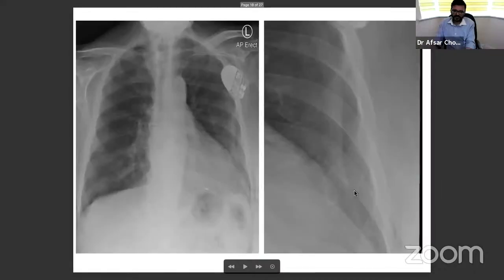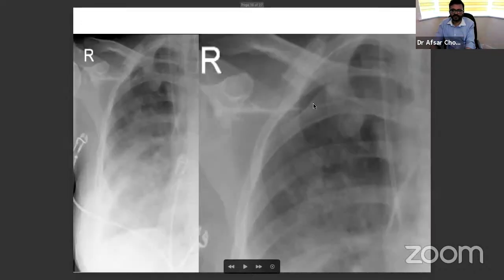No, I think we touched upon the pneumothorax earlier. So we already discussed it, but it's another example here. You can see there's a thick line, like a thick band. If your pleural line is here, it looks like a thin line. If you're seeing a thin line within the lung fields, and you can't see any lung markings beyond, you have to be very careful about the lung markings. That's the classical teaching, that you won't see any lung markings beyond that.